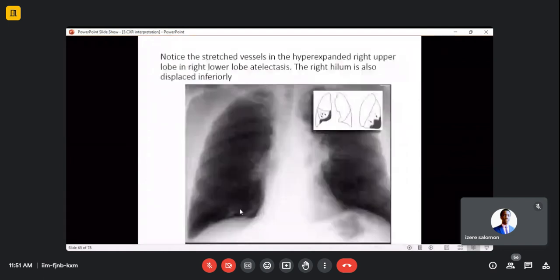Look. If you see this, I still analyze and stay systematic. Technically, it's not bad, it's not good, but it's cut off something. It's not deep inspiration. I can see maybe at 3, 4, 5, 6. Yeah, maybe deep inspiration.